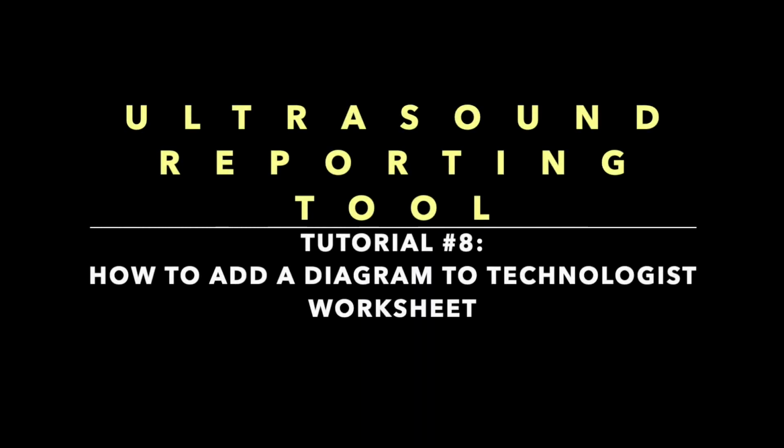Welcome to Ultrasound Reporting Tool. Tutorial number 8. How to add a diagram to Technologist worksheet.